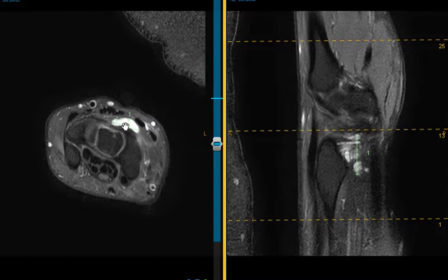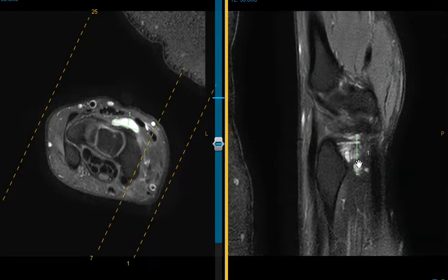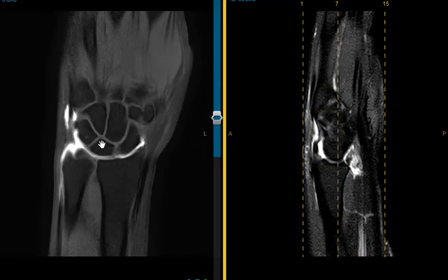So I looked at several cases, I think 10 MRIs of the wrist before this one, and looked to see if I could find anything that looked similar to show the surgeon that this may be a normal little fluid collection rather than a pathologic one. So here's one of the cases. This is an arthrogram where we filled the joint up with contrast, which is white here. So if there is any prolapse of fluid that's bulging outwards, it should show up on this pretty well.